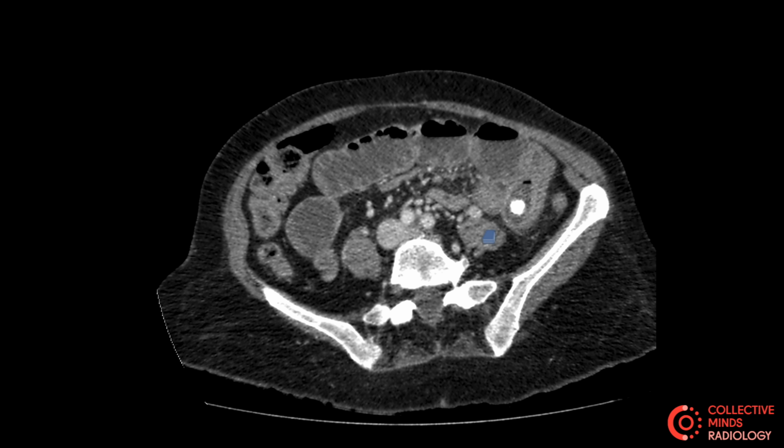So a few learning points here. We've kind of used our method of using gallbladder first and then found out there was an abnormality, and we were able to identify that defect with the duodenum. We're able to identify what is dilated small bowel by the valvulae conniventes, and then subsequently identify partially calcified gallstones located within the left iliac fossa. So a really interesting case, lots of great learning points.